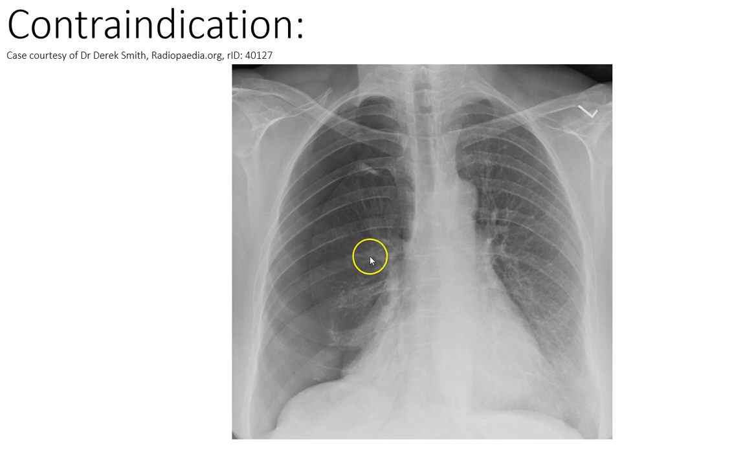It could have become a tension pneumothorax, in that I wonder if there's a bit of pressure coming across. The heart might be a bit squished across. Things are quite collapsed, aren't they? Maybe this hyperdensity is because there's pressure coming across and it's all getting a bit squashed.